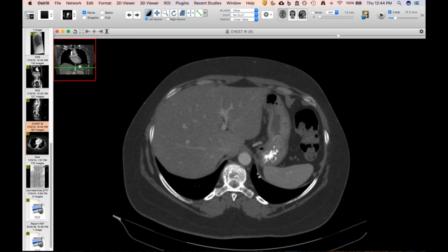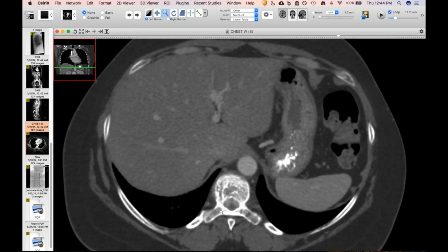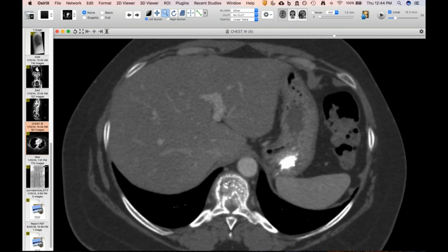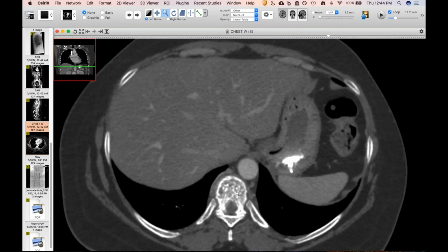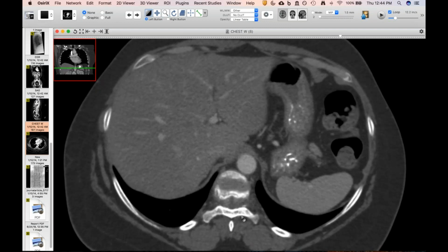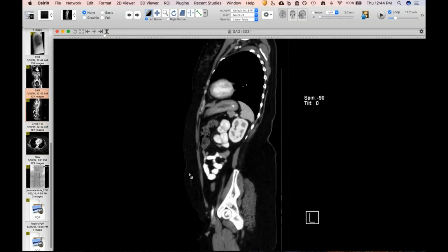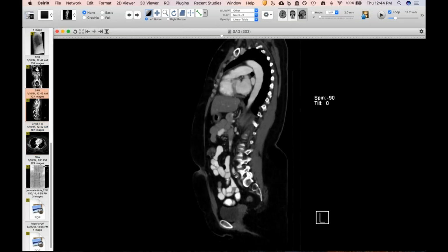And this one looks very similar to the one I showed just a few weeks ago. You have this hypervascular thing. I think this is probably a better example because you can still see the vertical striations in the vertebral body, but you can see how it extends posteriorly and is impinging on the cord, and is a very hypervascular lesion in the spine. I'll show you the MR and the CT in this case.